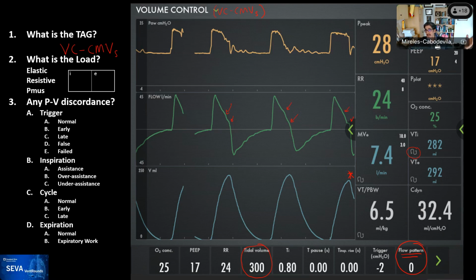And that's not in the manual, to my knowledge, and Rob, you can correct me, or maybe it is, but it's hidden in there. But it was the first time that we heard it, and lo and behold, when we turned off the circuit compensation, we saw it, and it's truly that. And if you put it on a simulator, it's truly volume control.